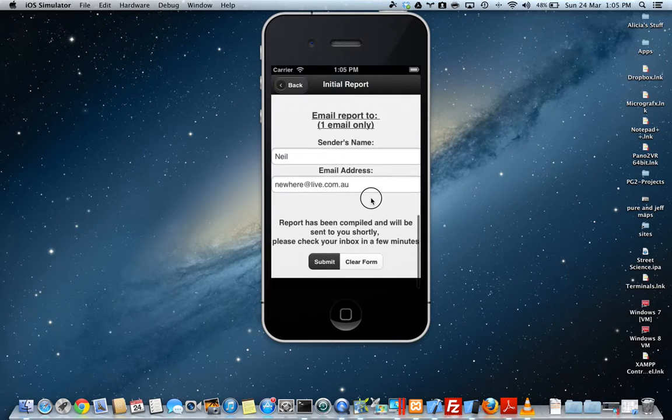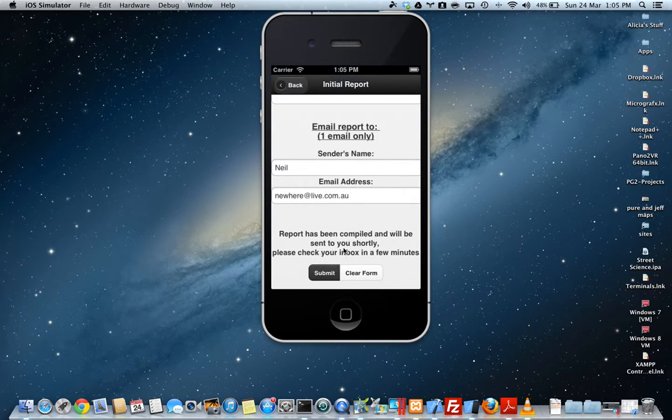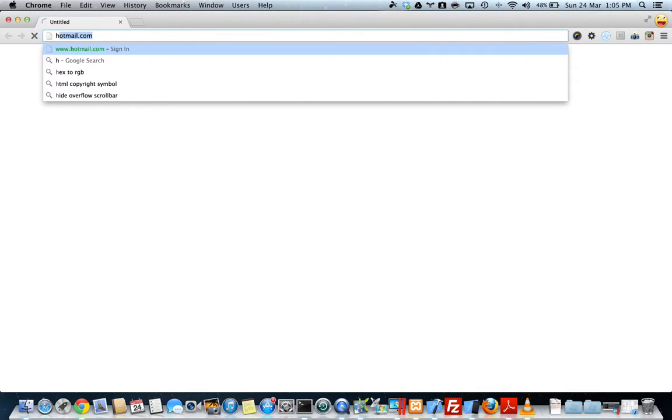So after you press submit, the report has been compiled and will be sent to you shortly. Please check your inbox in a few minutes. So what I'm going to do, let's see if I can check my email there. Let's go to hotmail.com.